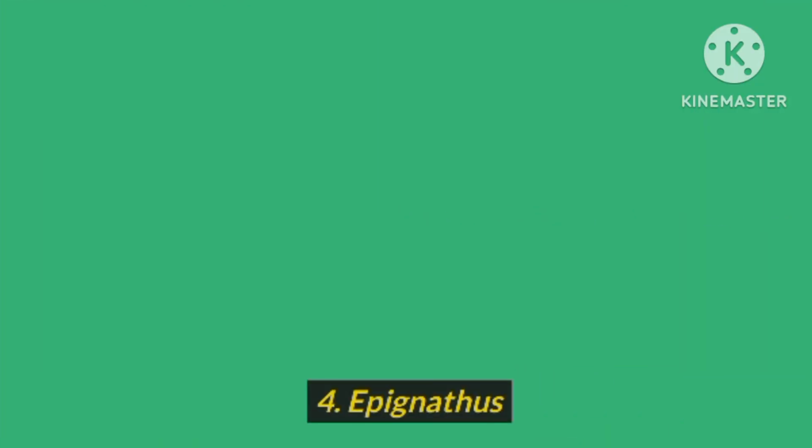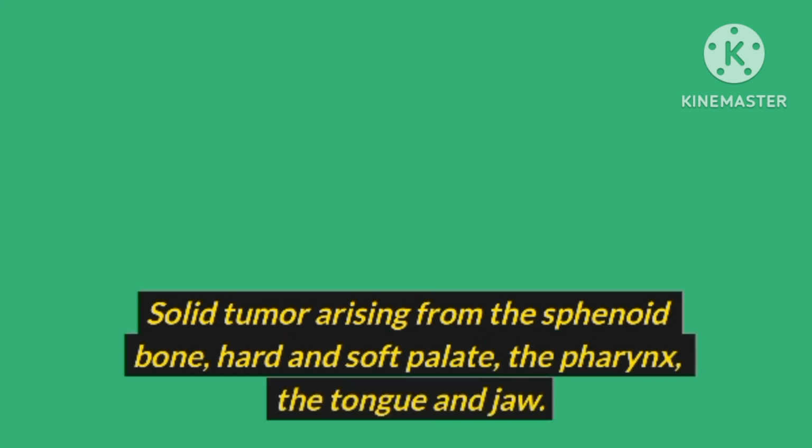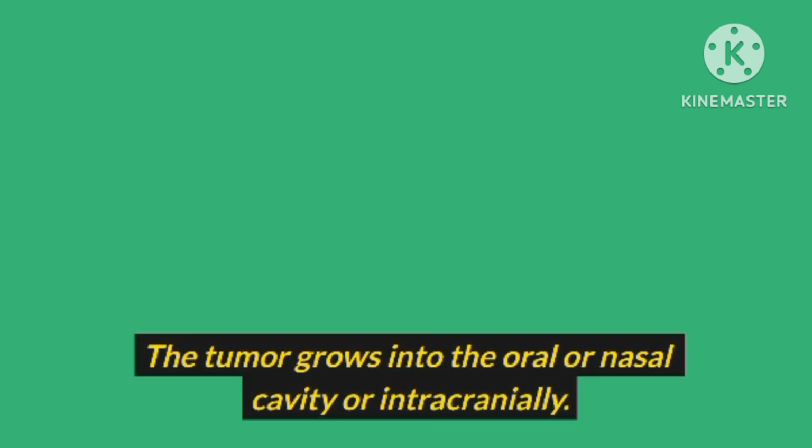Number 4, epignathus. Ultrasound diagnosis: solid tumor arising from the sphenoid bone, hard and soft palate, the pharynx, the tongue and jaw. The tumor grows into the oral or nasal cavity, or intracranially.